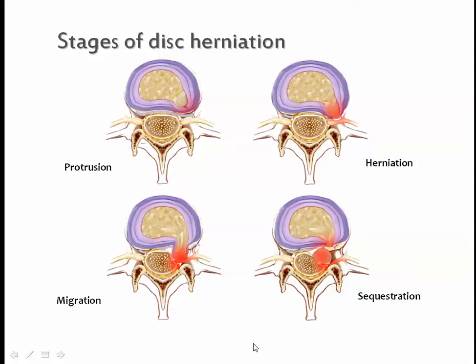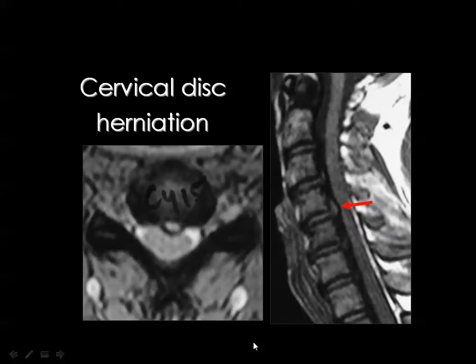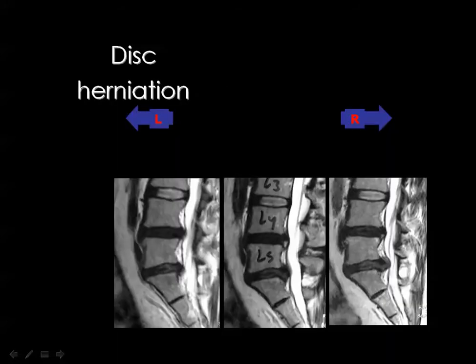Then, if you look here, this is the cervical disc at C4-5 level, and you can see the disc is extending inside the spinal canal and slightly going up. And this is the disc which is central disc herniation with cephalic migration, let us say. Then you need the axial images in order to decide the direction of the disc, whether left or right. And you can also decide the direction of the disc, whether left or right, from the sagittal images, provided that you have the full series of the sagittal images.